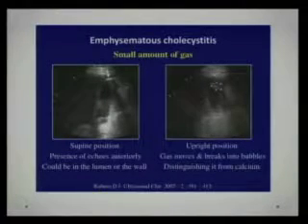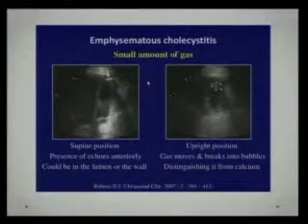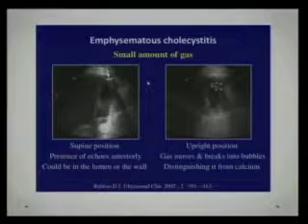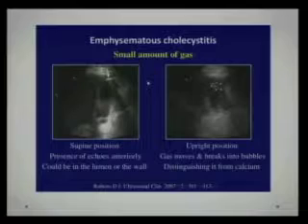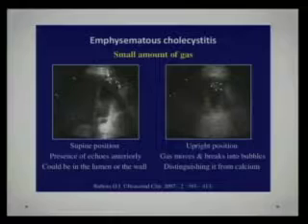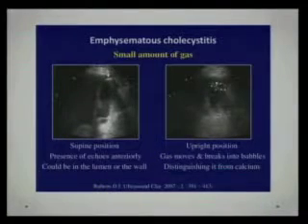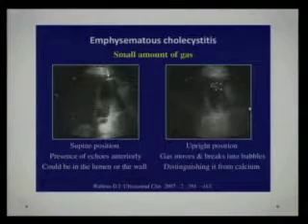Emphysematous cholecystitis, this is a patient who had a focal amount of air. You see in the region of the gallbladder fundus, patient is supine and there's presence of echoes anteriorly, and this could be either in the lumen or in the wall. So on an upright position, obviously the gas moves, breaks into multiple bubbles, and moves more superiorly, and this is what distinguishes it from calcium. Can we identify this as gallbladder air? Probably yes. This focus of posterior dirty shadowing, a focus of echogenicity versus the entire wall being echogenic, yes, that is suspicious. And if the same imaging appearance with change of patient position breaks up to tiny bubbles of air, could that be foci of gallbladder wall air? Yes, it could.